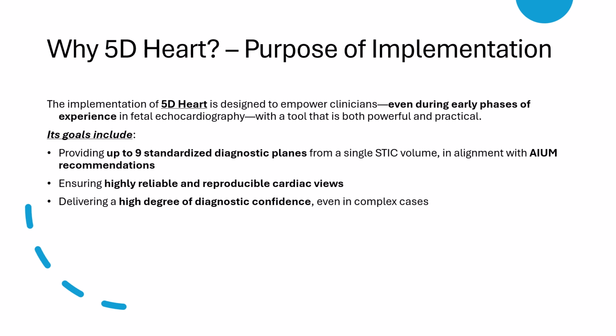Confidence in your findings, even in difficult cases or when anatomical windows are suboptimal. Time efficiency. What used to take 10 to 15 minutes of manual manipulation can now be achieved in under 2 minutes.